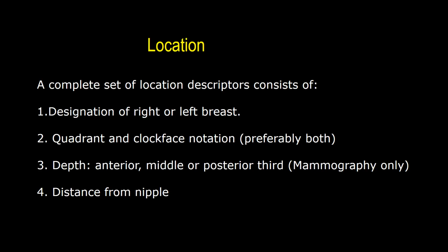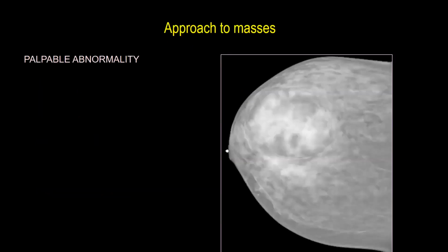Then the depth: anterior, middle, or posterior. The most constant and preferable measurement is the distance from the nipple.